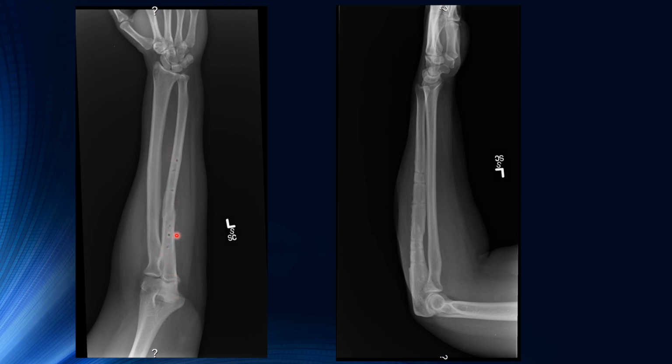So as much as you want to try after you have a fracture, you may not always get your anatomy perfect. However, you do want to try to get your epicondyles parallel here and straighten out the wrist, externally rotate the wrist slightly so you can get a better view if possible.